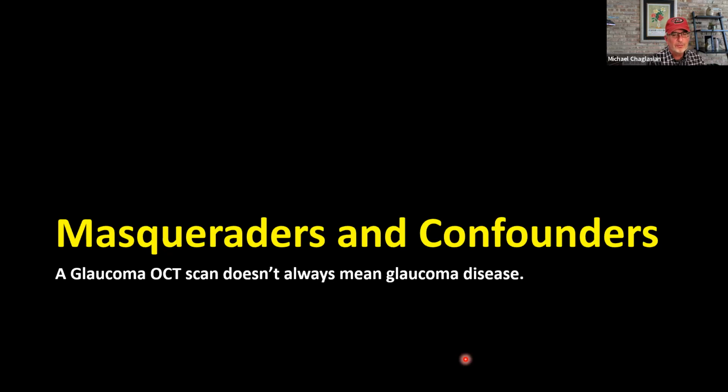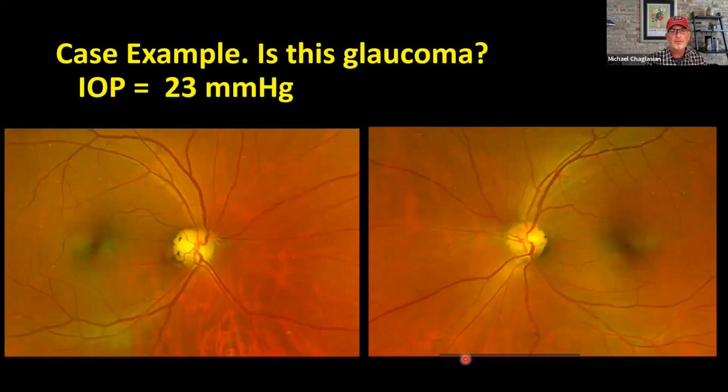And Joe, I'm sure you can attest that we see lots of referrals from our friends who think a person has glaucoma and really it turns out to be some other type of condition. Just because it's an OCT device and you're looking for glaucoma doesn't mean it will find glaucoma. So I thought I'd share a couple of cases to remind everyone that the OCT device will find what it finds, and we need to be a little bit smarter than the device sometimes, and take a more careful look at all of our testing.